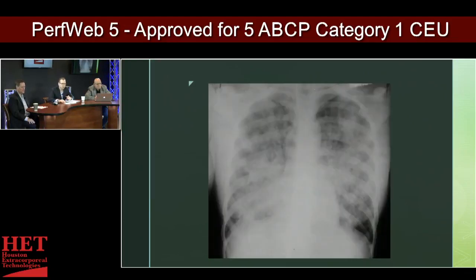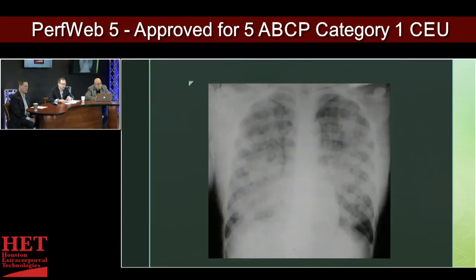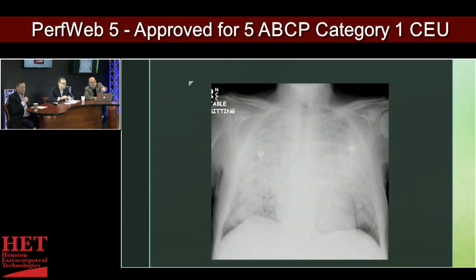So if you compare, it's obvious in these. This is an extreme example of somebody developing ARDS or a diffuse interstitial pneumonitis, inflammation, etc. And so that big heart, go back to what Patrick was commenting about. You've got that big heart down at the apex. Is that predominantly just from pulmonary hypertension, right heart failure, or right heart dilatation?